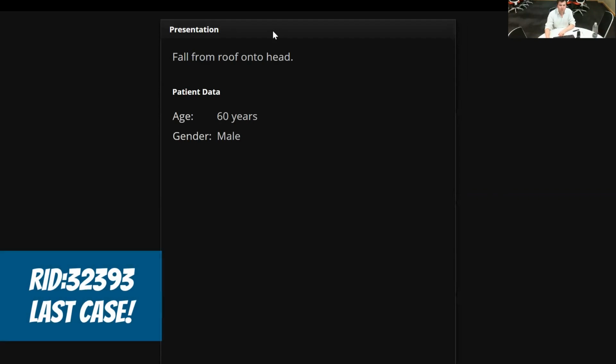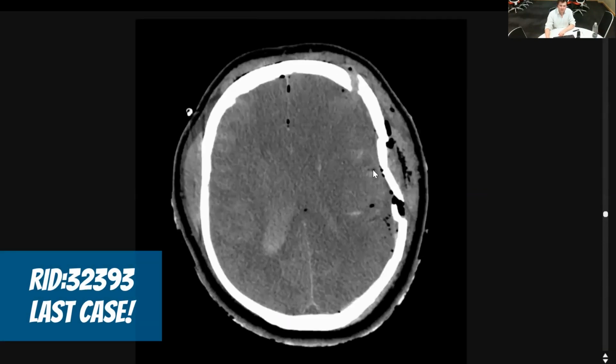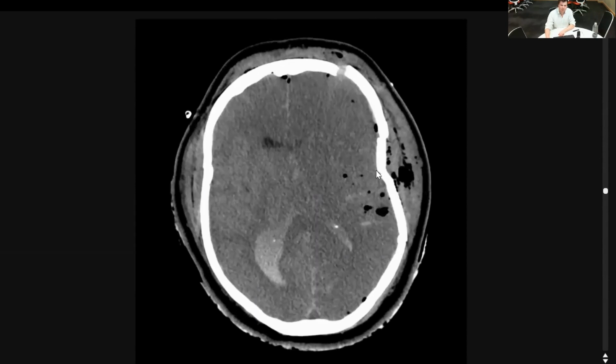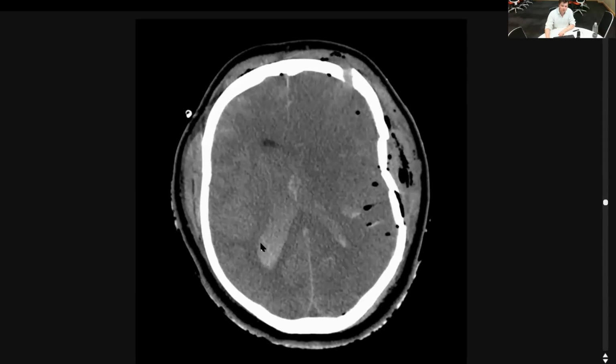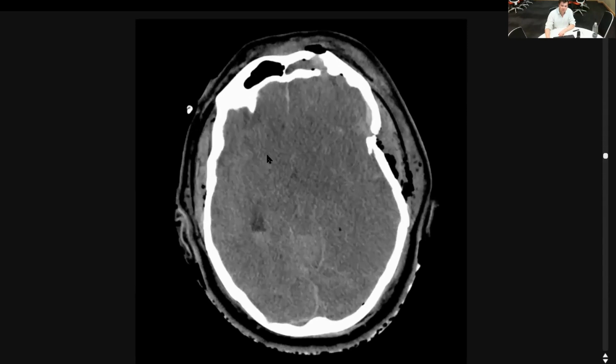Nice big juicy trauma. So your head's not meant to look like that. The guy's taken this skull like an Easter egg, cracked into there. It's got all the things that we don't want to see. We've got gas on the inside. We've got a little bit of surface blood there. You could probably stick your finger in that gap up there. Loads of intraventricular blood. That's just a little bit of CSF that's left around there.